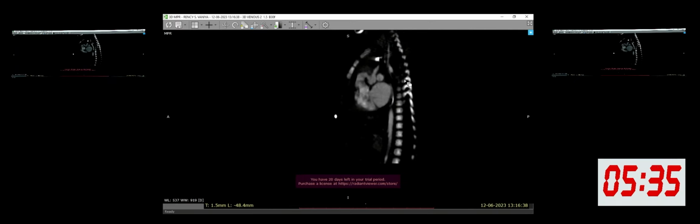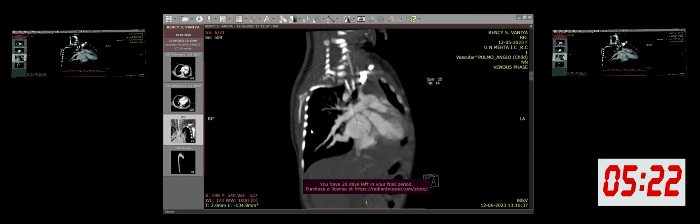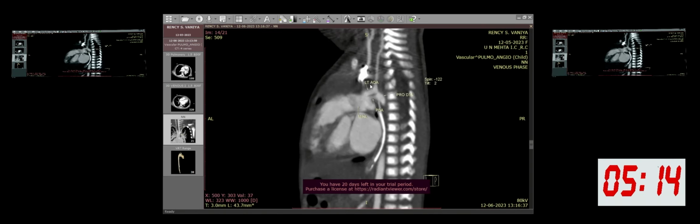So can you see, this is the superior channel and this is the inferior channel, both coming from the aberrant left subclavian artery and both going towards the MPA. I'll show you the reconstructed images also, annotated and reconstructed images. So this is the VSD, PH, the pulmonary arteries. What they've labeled as left aortic arch, actually it is the superior PDA and this is the inferior PDA. Two channels connecting the left aortic arch to the MPA bifurcation.